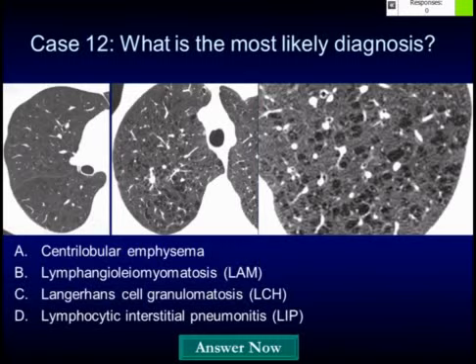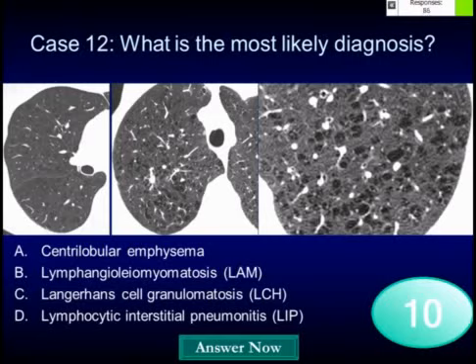So let me just give you, the image on your far left is one patient, and the image in the middle and the magnified image are from the same patient, but a different patient. Please vote. Go ahead and vote. Please vote. Oh. Yeah. There you go.